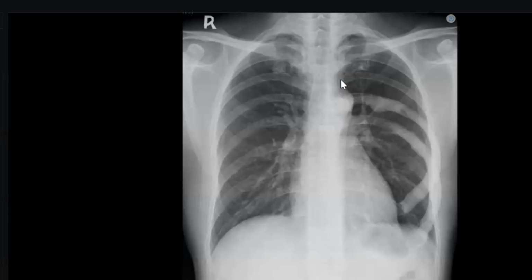Okay, it is candle wax appearance, but what is the underlying pathology? Sorry, I have no exact idea. I think there is metaplasia of bone. I'm not sure. Osteitis, at least. What happened here? Periosteal reaction and cortical thickening. This is a type of osteitis.